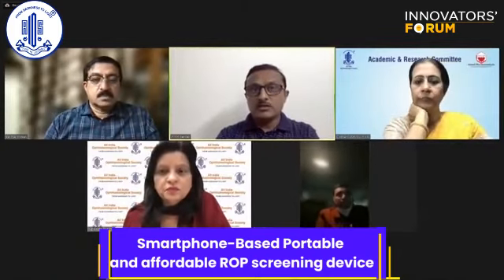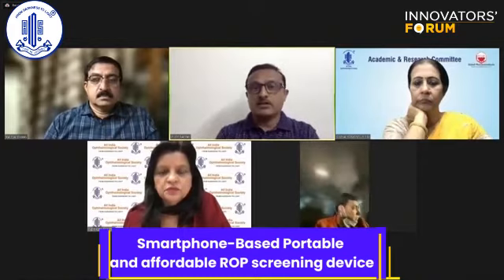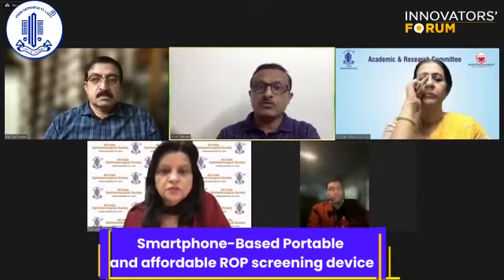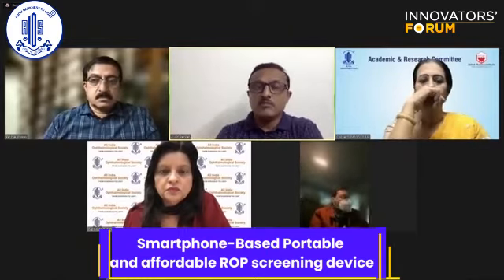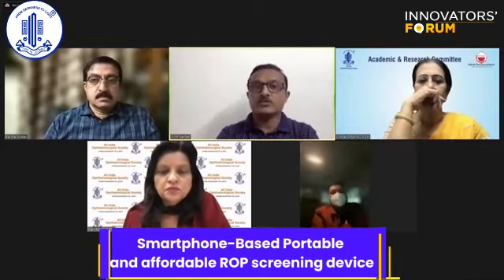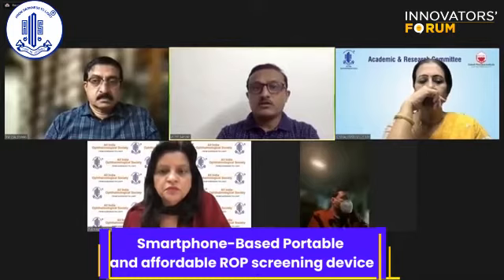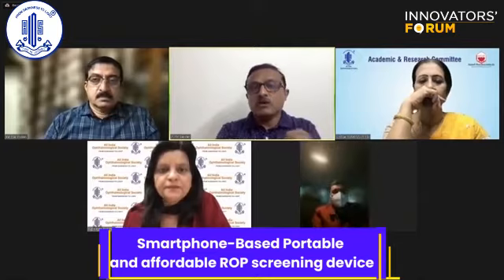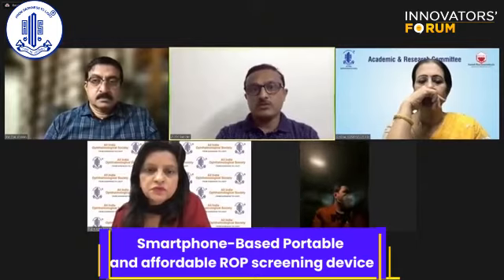The other advantage is that the device that I showed you is just the RETCAM version, but with the same thing, we just change the ring and you can use it for adult photography. So we are using it for diabetic retinal screening camps where we send a team to peripheral rural areas and even primary healthcare centers, and we are training the nurses just to take pictures of diabetic patients. It's so easy that most of us feel that within 2 to 3 months, even a person who is totally non-educated is able to retrieve very good images.